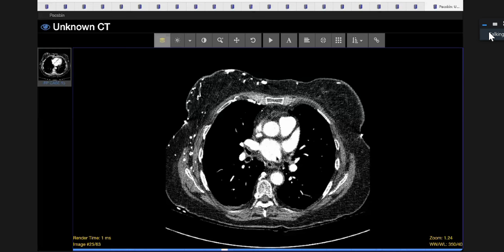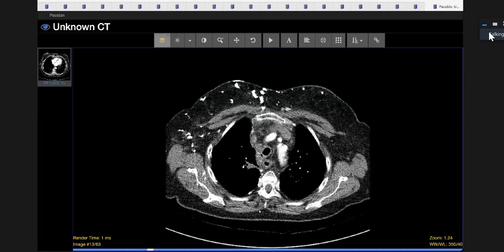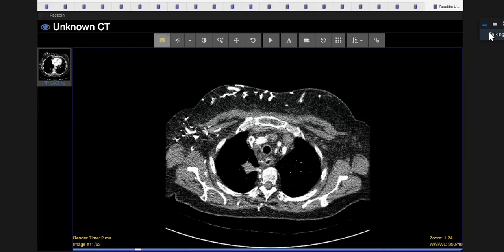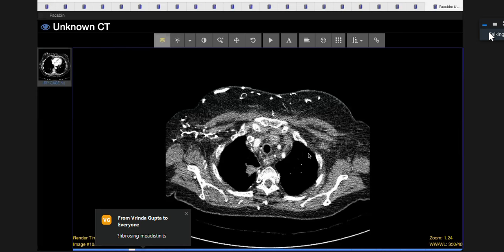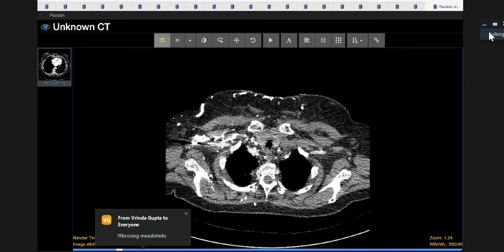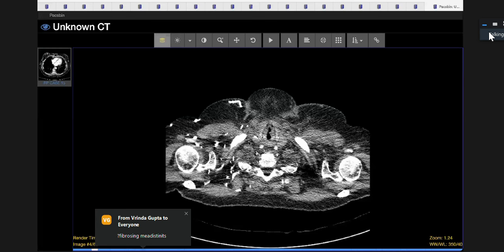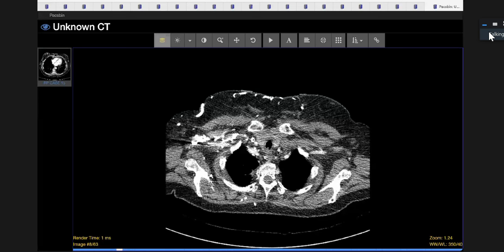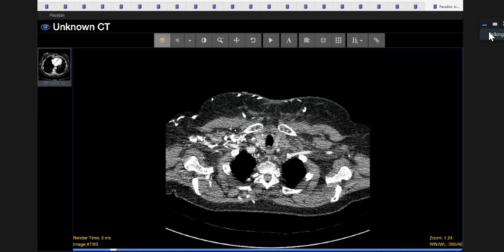There's also non-opacification of the SVC. I can't see the SVC at all, right? Yeah, with tumor extending along with possible clot also in the SVC extending to the right subclavian artery. Where's the clot in the subclavian artery? Oh yeah, well, possibly. And have I noticed that before? No, but I think so.